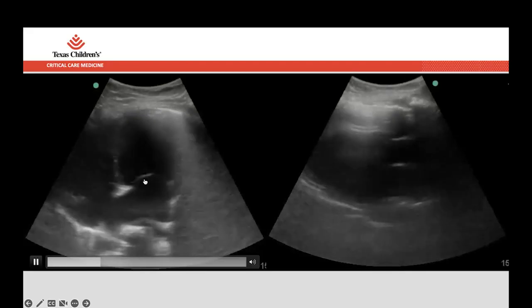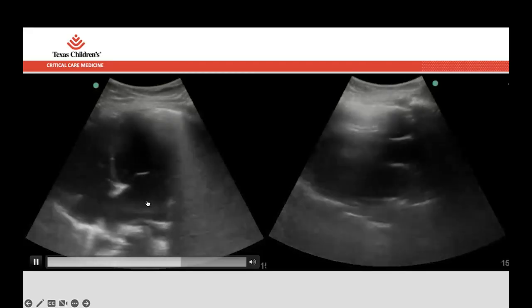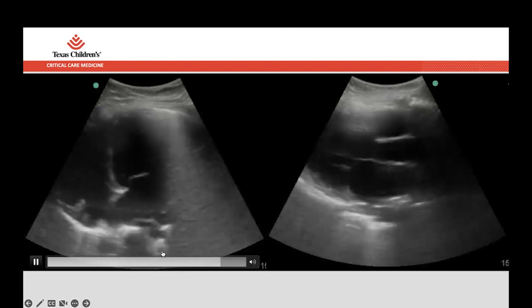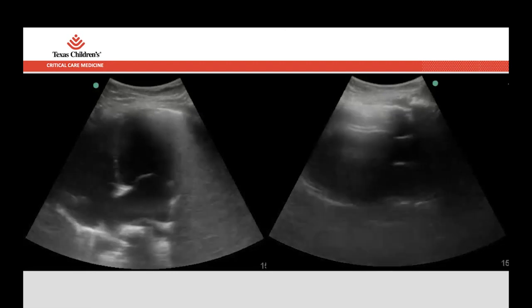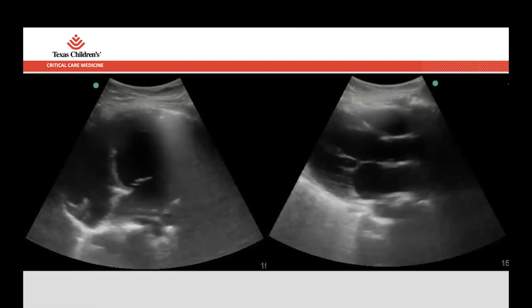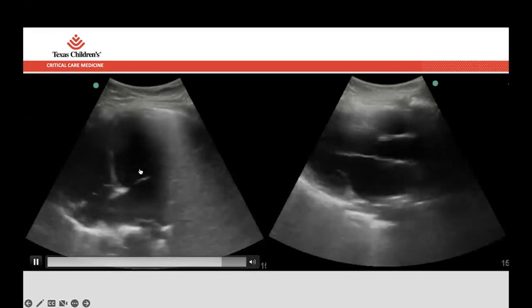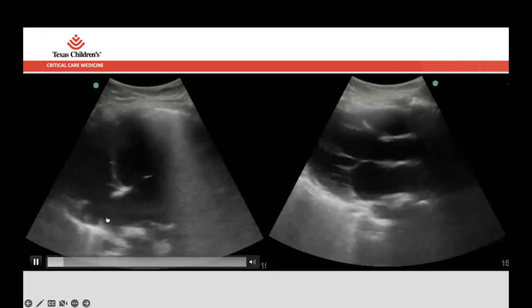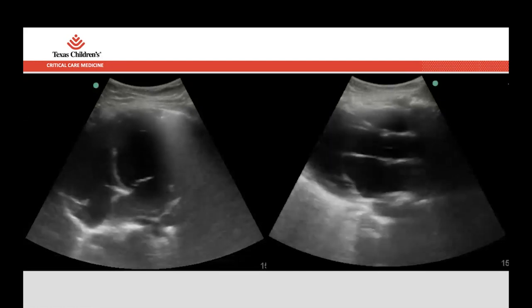Our valves don't have much excursion in diastole. They don't flop around too much, or the atria are a little bit dilated, which goes along with difficulty moving blood forward into the ventricles. And so function often is exactly what you mentioned. It's looking at the size of the LV and the RV. They don't move around that much, and the structures look blown out.